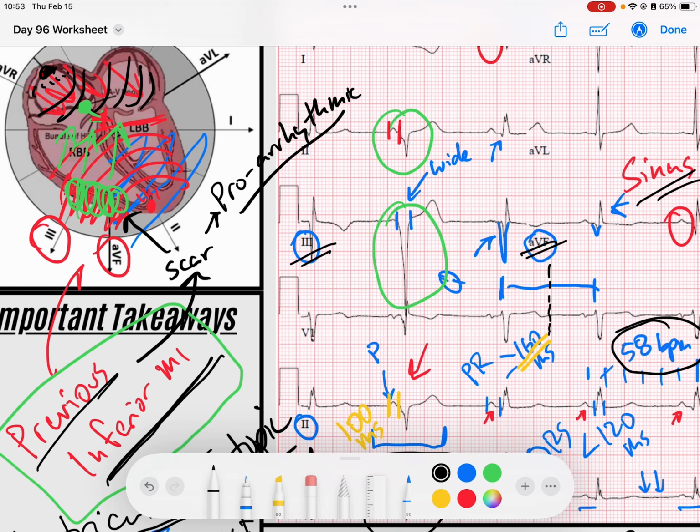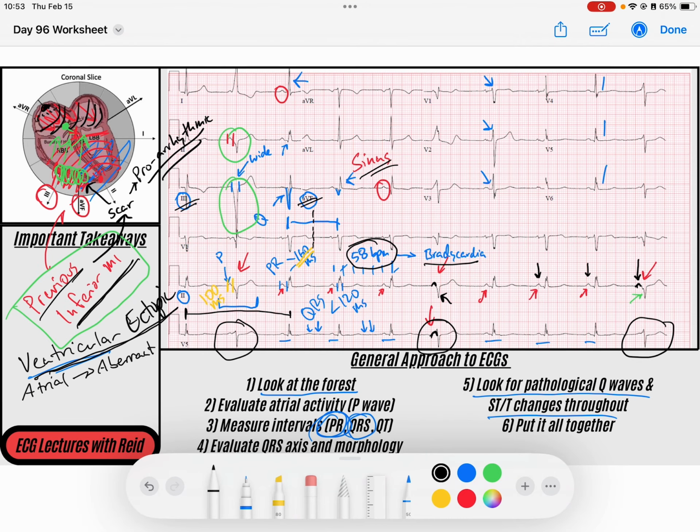And so what you don't want to happen is for someone to have a focus in that scar tissue that could be firing off these ventricular ectopic beats, and that if they get too hyperexcited, it could create a ventricular tachyarrhythmia, and that would be potentially lethal. So I would correlate these ventricular ectopic beats clinically, and really be cautious when you see somebody with a previous MI with ectopic beats that look like they could be arising from that region.